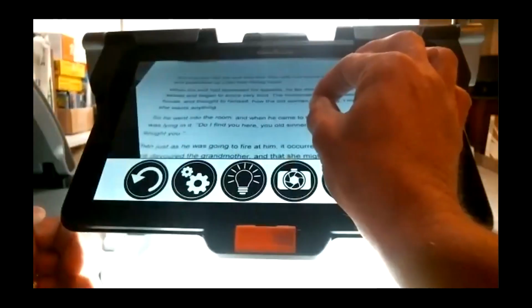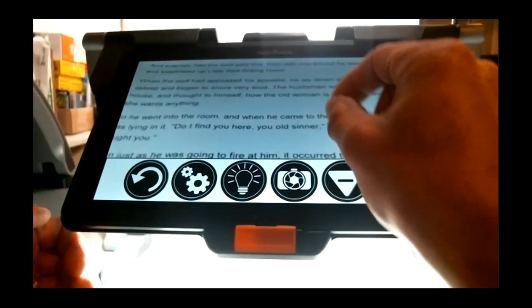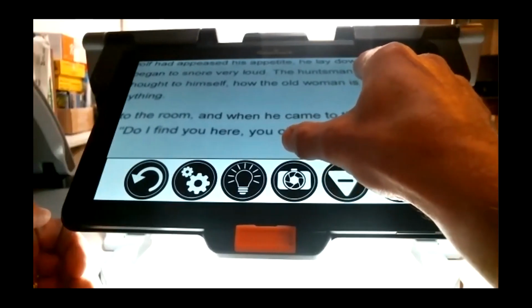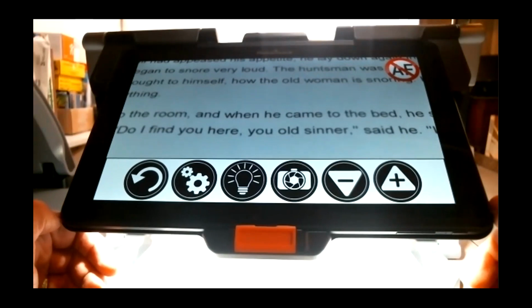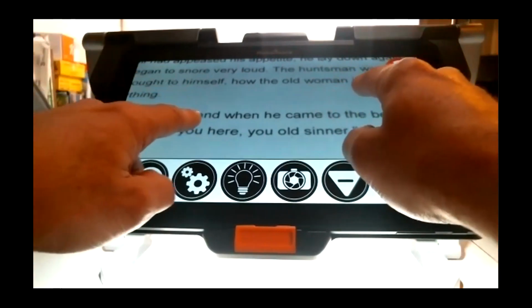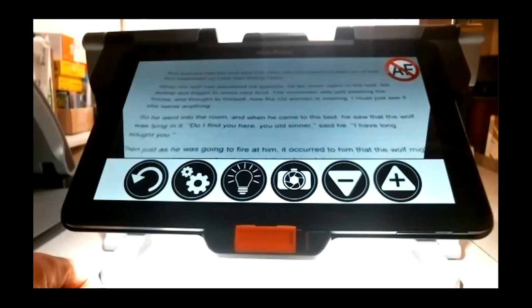Another gesture, the pinch and zoom. Pinch and zoom is two fingers. It could be my thumb or my index that I can start off glued together or very close together and then move apart. That will zoom in my image. Most people already know this kind of gesture. It's used all through our iPhones or iPads or tablets out there in the mainstream. Like I said, you can use your index and your thumb, or you can use two index fingers and move them closer or farther from each other, and that will zoom in or zoom out.